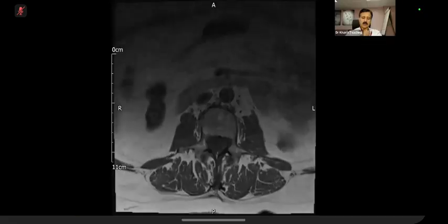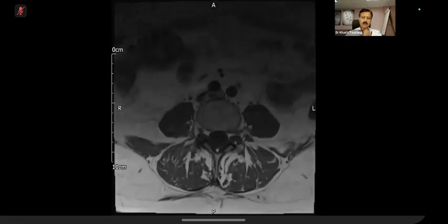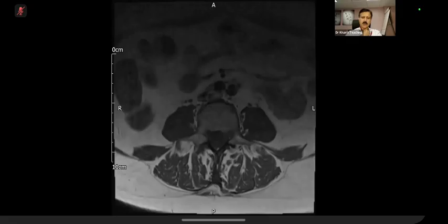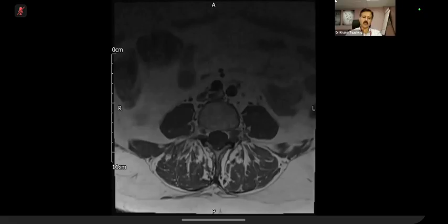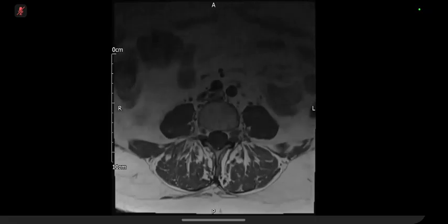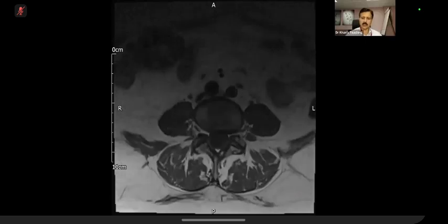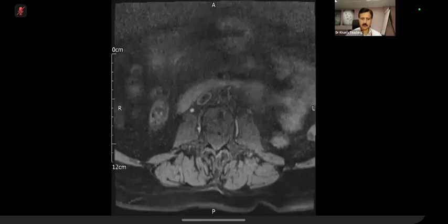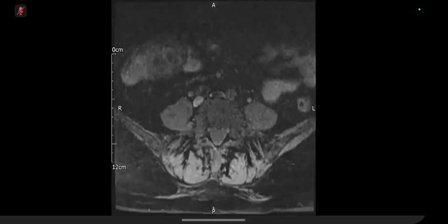Continue. Have you gone back? Excuse me. Don't stop here. Please continue. Let me just speak up. So I think the lesion is again seen. Can you hear me? Yes, I can hear you. I don't want you to describe the sequence. Please go to the next series. Okay. And this was a pre-contrast. Please go to the next series.